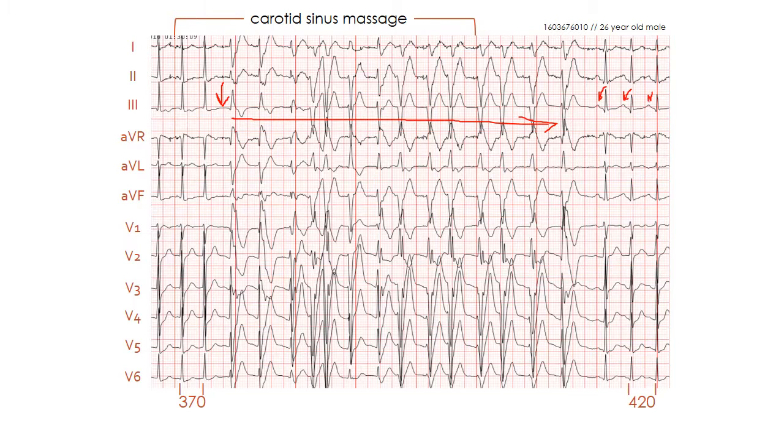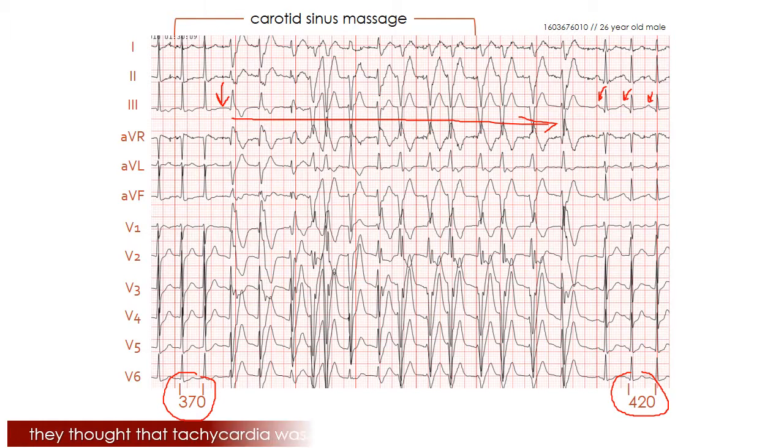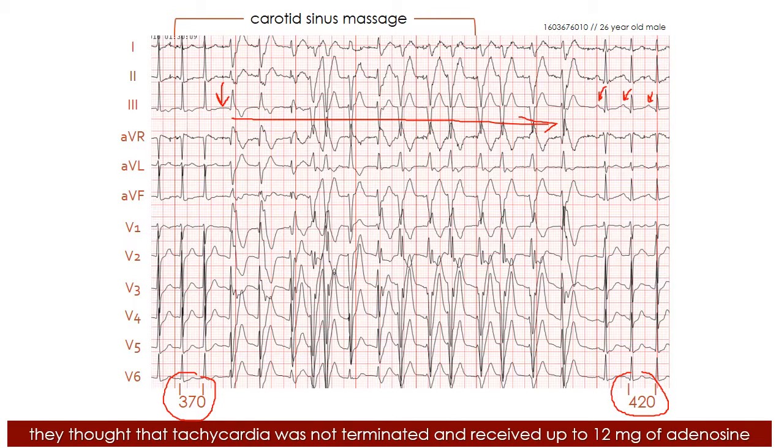The cycle length of this sinus tachycardia was 420 milliseconds, similar to the cycle length of the paroxysmal supraventricular tachycardia. Because of this, our physicians on duty did not realize that the patient had regained sinus rhythm, and they infused 2 boluses of intravenous adenosine. The patient was nervous, and sinus tachycardia reflects here a situation of increased sympathetic discharge.